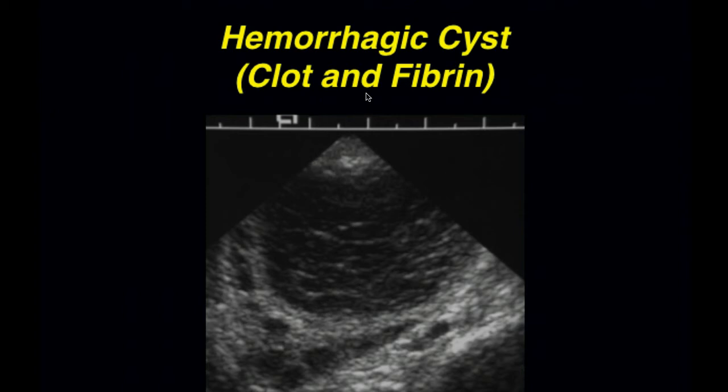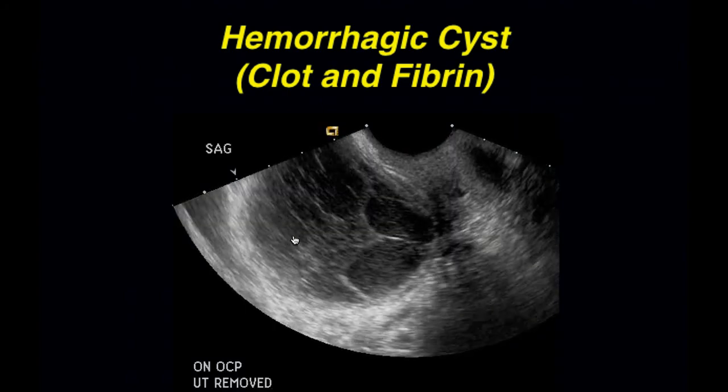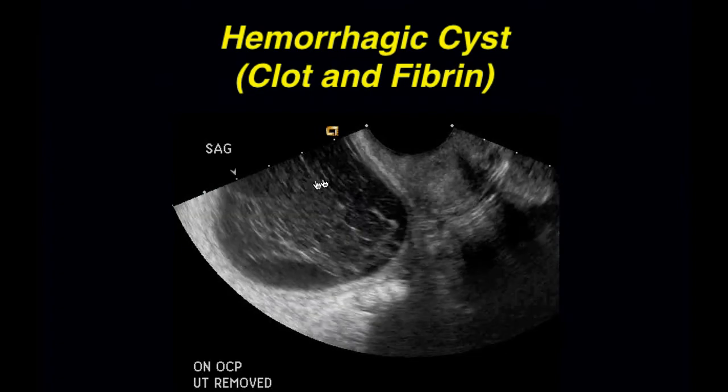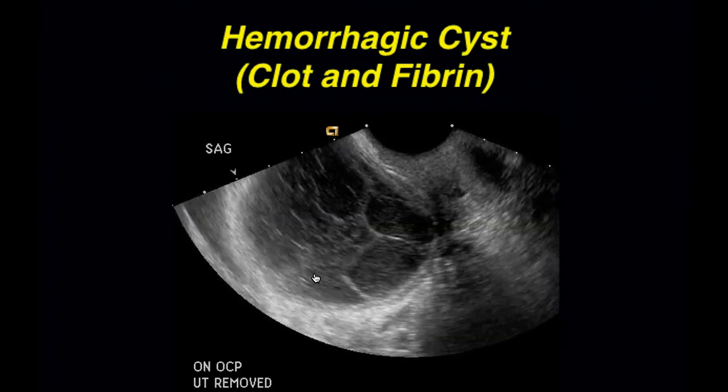This is typical of clot and fibrin. Look, I've seen neoplasms with 30 septations in them, but they don't have 30 septations per cut. There's simply too many of these things to be septations in a neoplasm. So again, there's far too many of these little lines to be septations in a neoplasm.